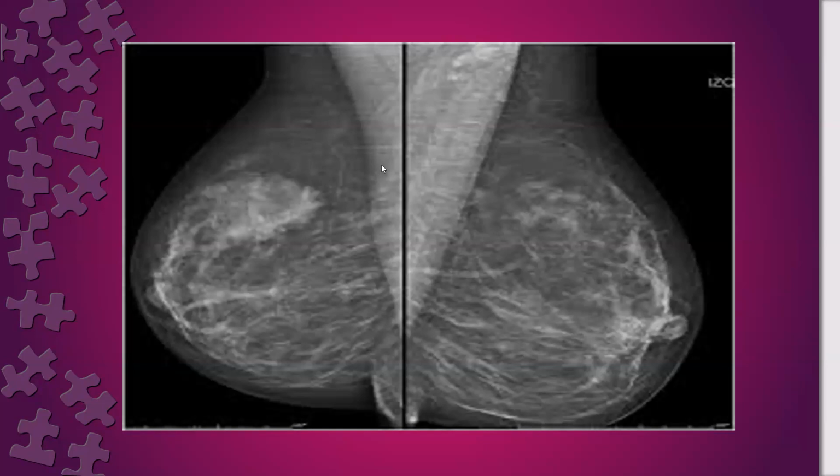This concavity indicates what? It indicates the muscle is atrophied, contracted. When the muscle is contracted, that means some of the breast is not included in the field. This might aggravate the smaller size of this breast.